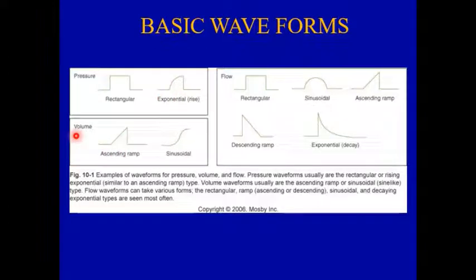And now in the case of the volume time waveform, we have this ascending ramp. The ascending ramp is seen during mandatory breaths, and this sinusoidal waveform is seen during spontaneous breathing.